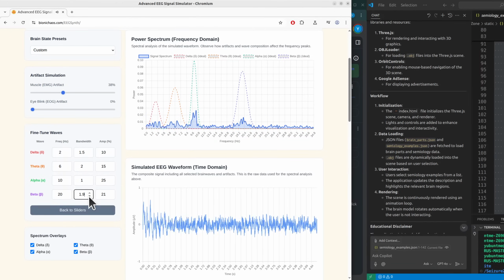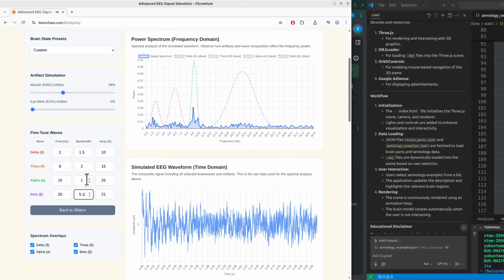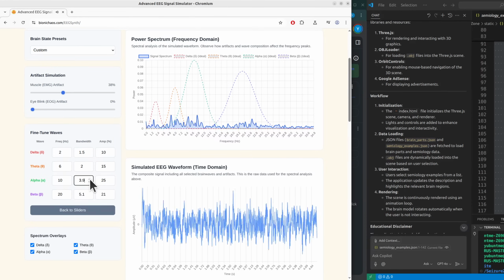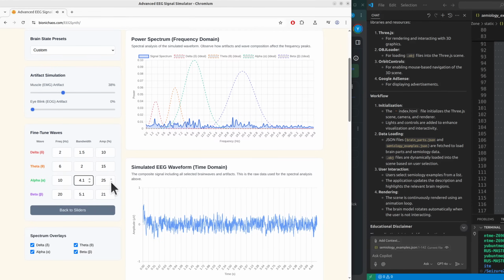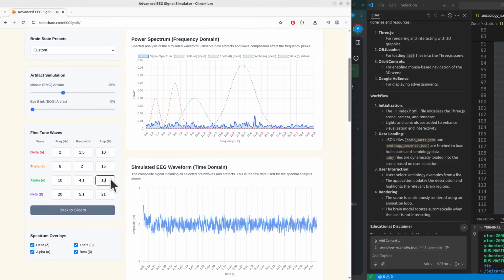And you can just adjust sliders for these. There's a simple mode, yeah, with sliders to quickly change the relative strength, the amplitude of each band. Easy way to play around. But the source mentioned a customize mode, too, for digging deeper. Exactly. In customized mode, you can get really specific.